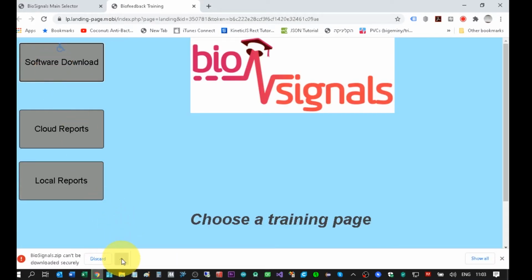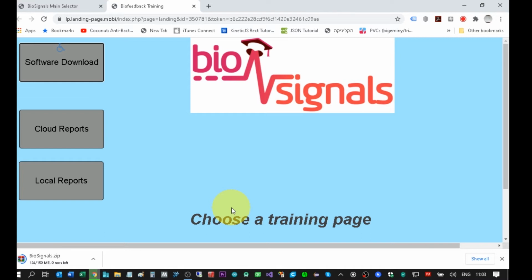Now we need to confirm to keep this file, as this file is okay. Let's wait for the download to finish. It will take some time. Yeah, we need to wait. I don't want to stop the video now and then start again, and so on. It's not too long, and it's better to be accurate when doing this kind of demonstration.